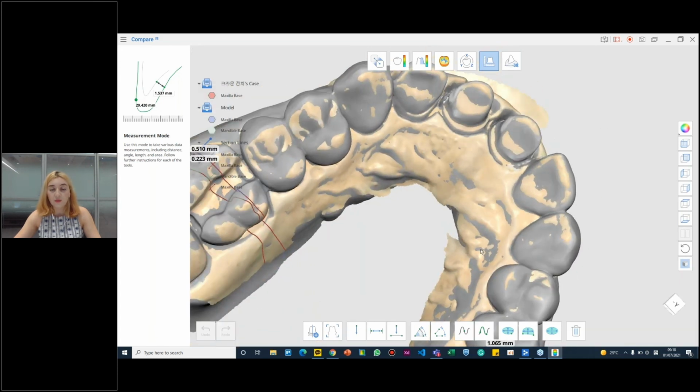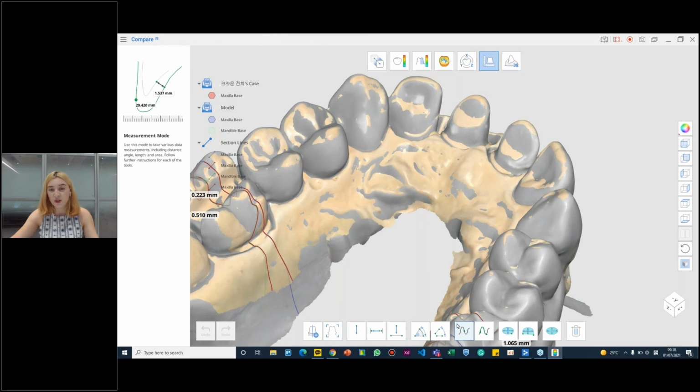You can work with a lot of different functions here, so you can measure the area, the distance and angles and all of that. And also I'm seeing that right now people have started to use that much more, and they come up with really amazing cases that they use these functions for. So hopefully we'll be able to share all of that soon with case studies and maybe in the Facebook group.